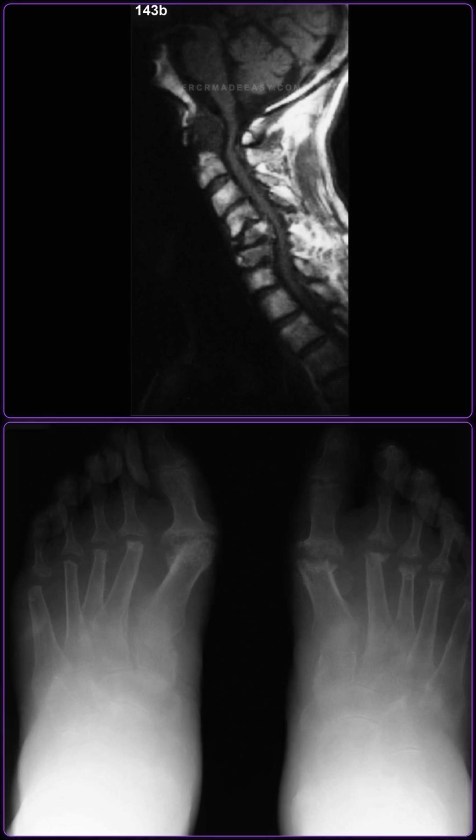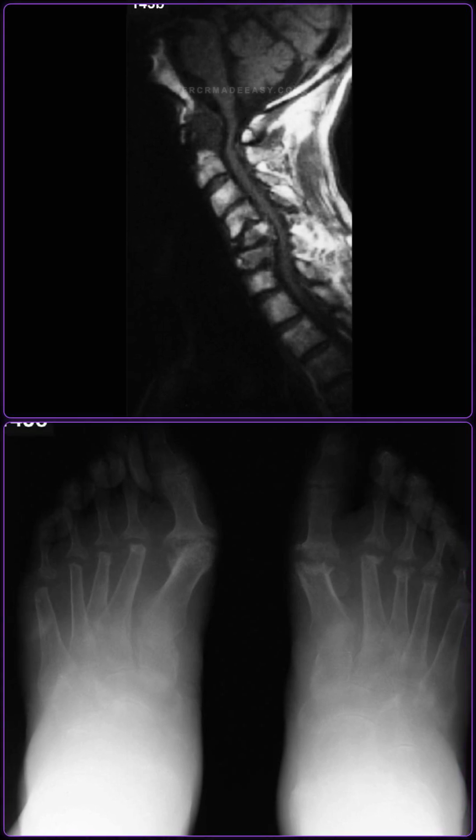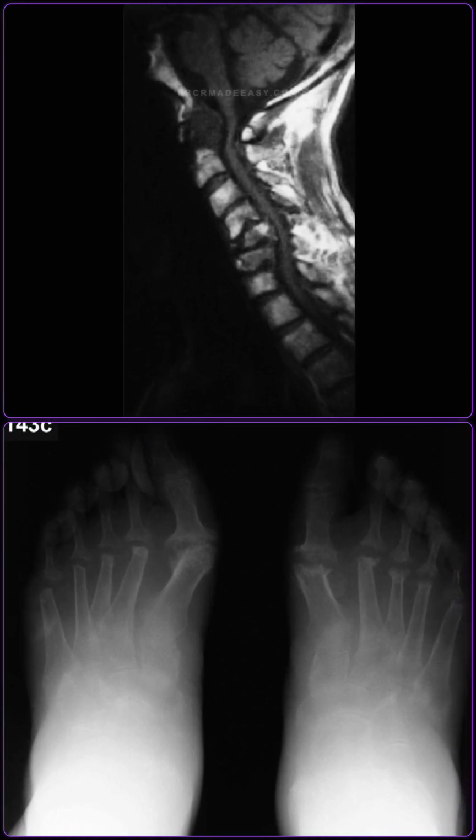As a radiologist, I would immediately call the referring clinician to report the unstable subluxation, recommend neck immobilization in a hard collar, and suggest an urgent MRI of the cervical spine to assess cord compression.